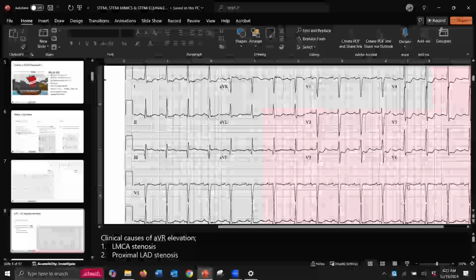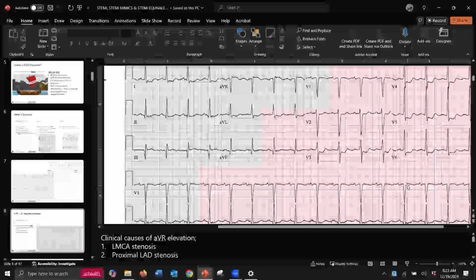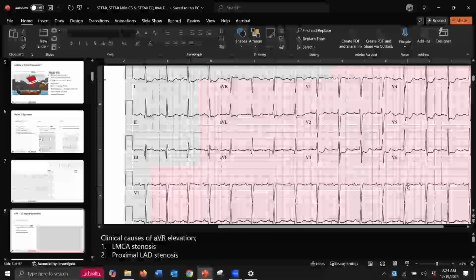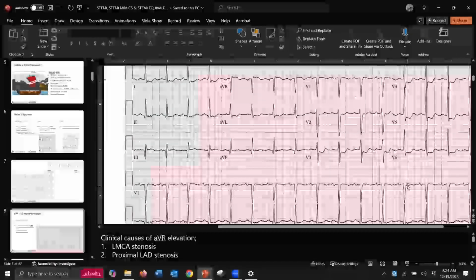It's reciprocal in 1, right? So it does meet reciprocation. I look at this EKG and go, oh God, I don't like this at all. But how do I communicate that to get a heightened sense of awareness to the receiving facility? That's a question.